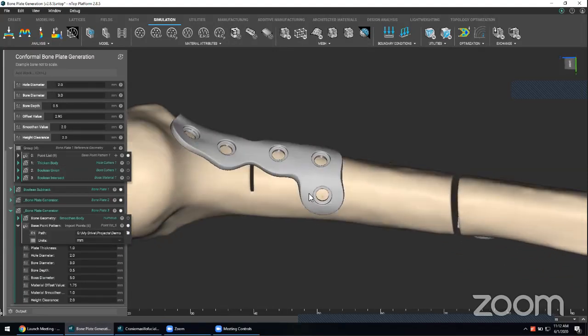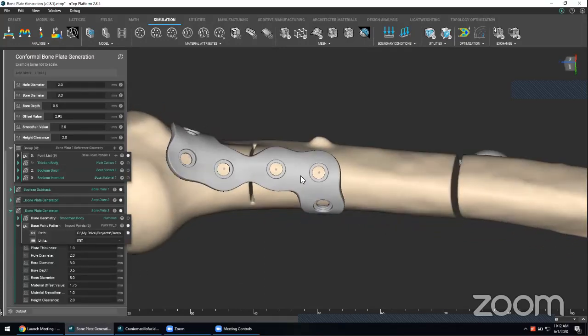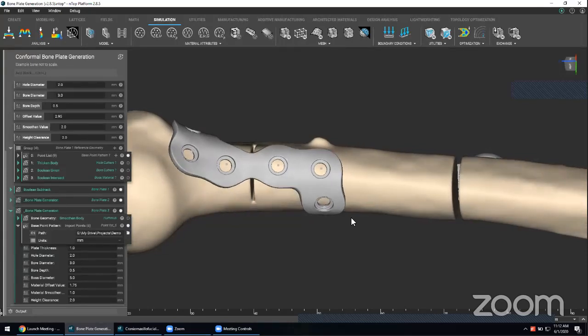So this is a pretty simple way to address the need for more material if you were to tweak this number here. But there really are a lot of other approaches and solutions that are possible as long as they are considered with forethought and built into the workflow itself, right? This option that I changed here bumps up the amount of material generated around each hole. But if you wanted to just add more material over this span gap, that's something you could build into the workflow as well, right? Build in that flexibility. But at the end of the day, all these approaches can still originate from only a base set of points.